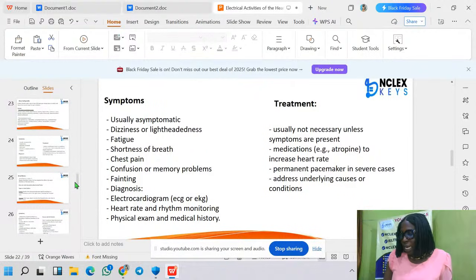No. Okay, let's look at the P wave of the patient. I intentionally put it on WhatsApp so that you can extend it as long as you want. Is this looking like a normal P wave? A normal P wave will be round, preceding each QRS, occupying 1 to 3 boxes. I'm sure that by now you know where the P wave is, so I don't need to start showing us again. Is this P wave looking like a normal P wave?